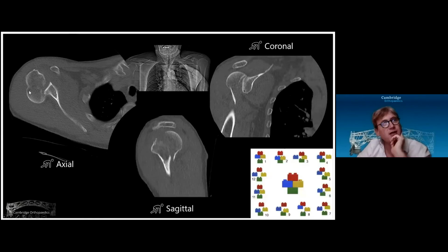We see how the articular segment is separated from greater tuberosity, separated from lesser tuberosity, separated from shaft. So it's one of these four. But there's no real fracture between the tuberosities, and there's no separation of the tuberosities from the shaft, and therefore it's these top two. And so it's this two-part fracture dislocation where in fact the blood supply has been disconnected from the head.